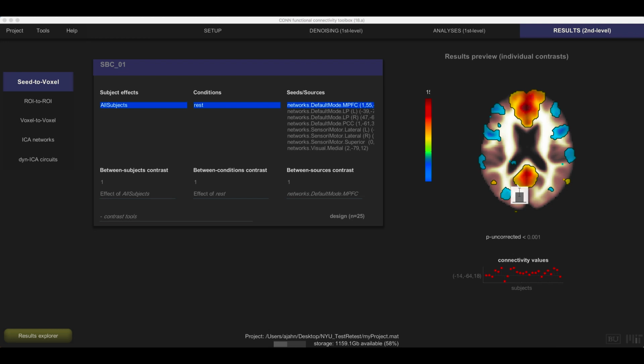That's in contrast to task-based. But you'll notice that at the second level, these effects are actually blurred a little bit. Partly for aesthetic reasons, partly after you've already done the connectivity analysis. If you then average together, say, some nearby z scores that have been transformed, you can, in that case, actually boost your signal a little bit. I don't know how to directly control that, but that's why this thing looks the way it does. It's been normalized to a template. There's been some interpolation going on, and it's also blurred a little bit as well.